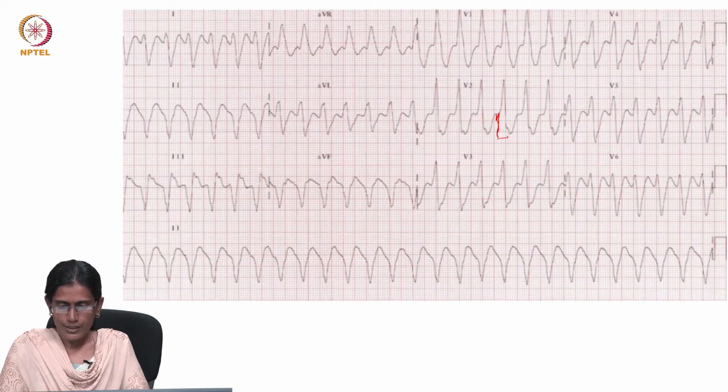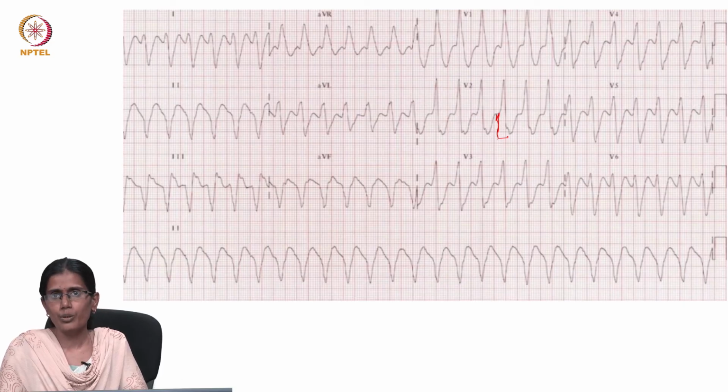So, when you come across an ECG like this, you have to alert your team immediately. Probably the patient may be having myocardial ischemia or infarct. You have to recognize it and treat it promptly.